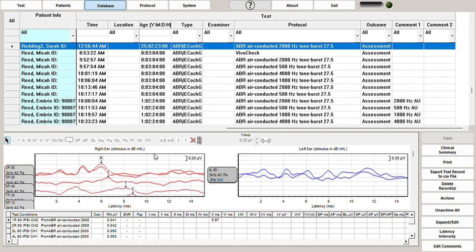So I'm going to put that one, it is not so good, 0.27. Sometimes people will adjust these in a little bit, still not ideal. So let's just keep going and see what some of these other correlation coefficients are. That one's much better, so 0.58. And we had it at 0.60 there. But again, you can kind of play around with it just a little bit. You don't want to mess with it too much. Statistical start and end here. That's 0.70, so that's good.